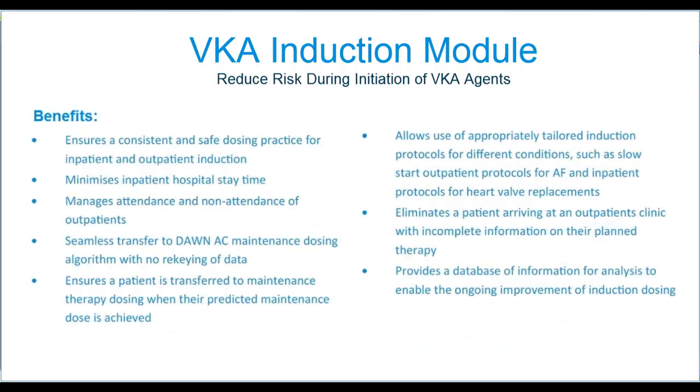There's also the risk that an induction patient might not be picked up necessarily, so a user might not notice that the patient is an induction one. So for that reason, we have the induction module, which is specifically designed for tracking and dosing patients that are being loaded onto warfarin. The induction module is used to start or restart a patient on warfarin, and it tries to determine an appropriate maintenance dose using the established protocols within the system, or potentially your own custom protocols as well, so we can put in your own induction algorithms.